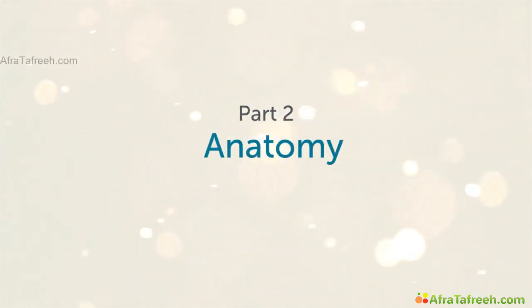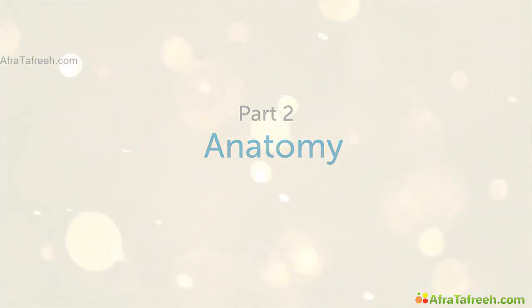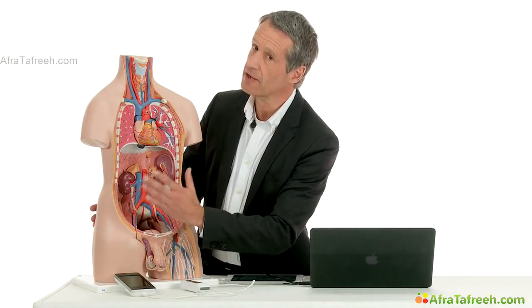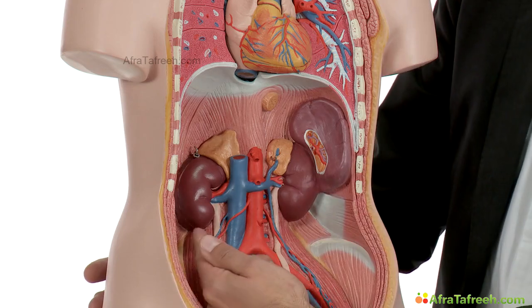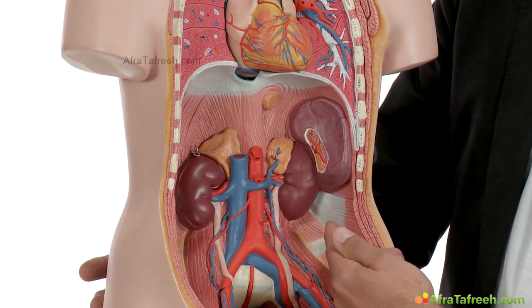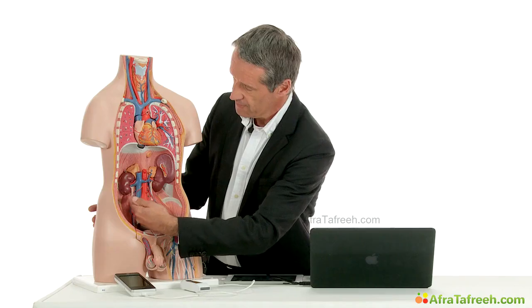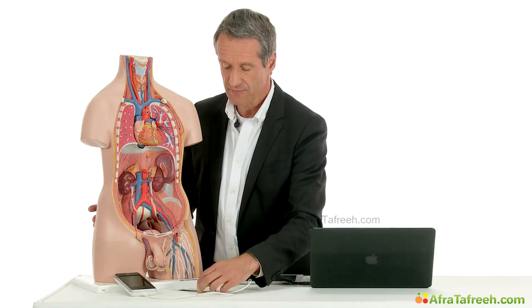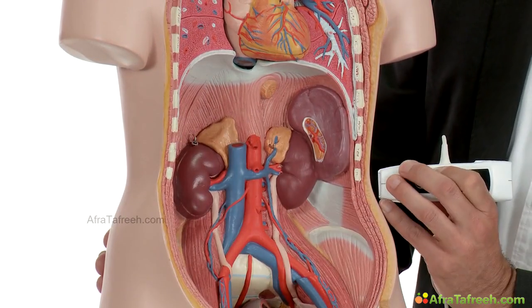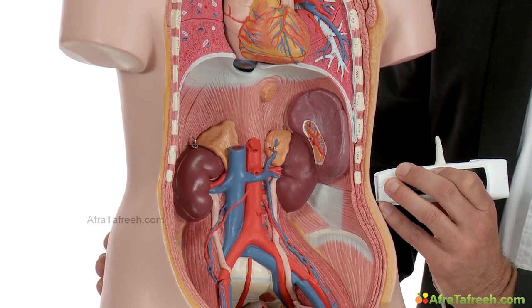But where are the kidneys? Where do we find the kidneys in the human body? Let's take a look at the anatomy model. We removed in this torso all organs which are in the way. And as you can see here, the kidneys are located in the retroperitoneal space at each side of the human body. To scan the kidneys, you have to do lateral views from both sides to avoid the bowel gas.